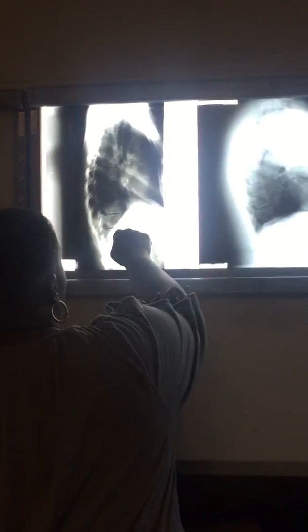And so one of the key things in positioning, what needs to be in the center of our radiograph? T7. So center of our radiograph is about right in here. So this is about T7 here. And then you can go from there as to which ones they are. But this one is L1, 12, 11, 10, 9, 8, 7 is about right here for this one. So somewhere in this area here, you should see the 7. You can use that as your reference. 7 and 8 will be right in the center. And so that could be your reference.